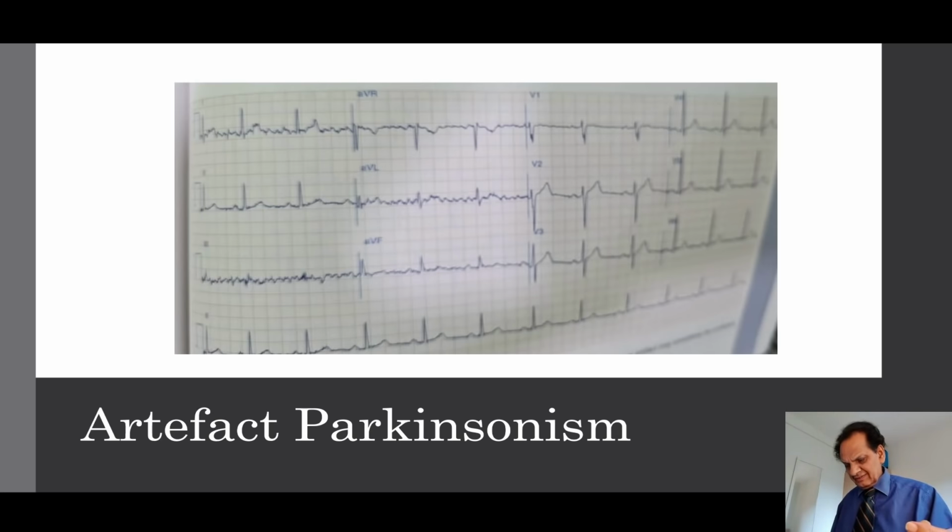What is this? There are some fibrillatory waves. No, it's an artifact in a patient with Parkinson's. Never forget this also, because you may misdiagnose the patient.